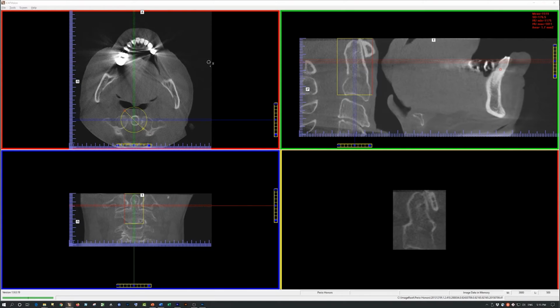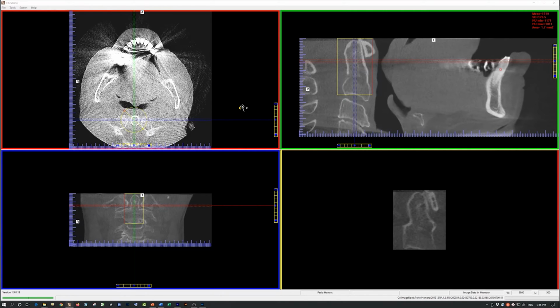Let me show you an example of very sharp. The image becomes very pixely. So very sharp, this is how the image looks. Not very diagnostic, so I'll go and leave it back to normal or sharp and mild.